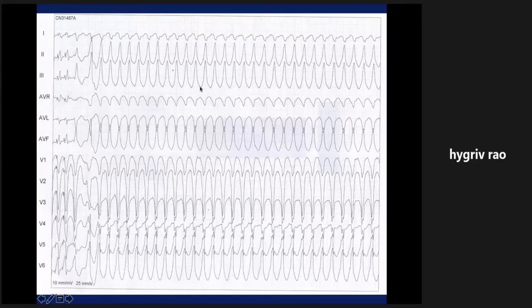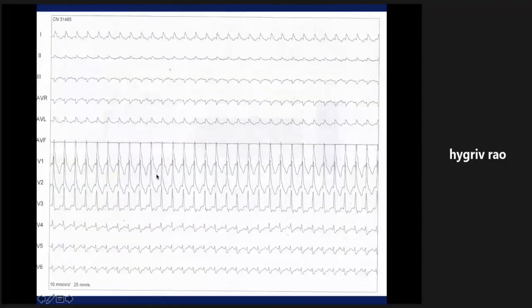Thank you very much. So here you have the QRS, there's a VT, there's VA dissociation, and it is an RVOT VT. It's pattern recognition. Similarly, this is again the same ECG which I showed you before, a narrow QRS looking kind of VT, but there is VA dissociation, right bundle branch block, and you can see that typically these are left axis, can also be right axis. But when you have this kind of ECG, it's a fascicular VT. So RVOT VT and fascicular VT are through pattern recognition, where you just make a recognition.